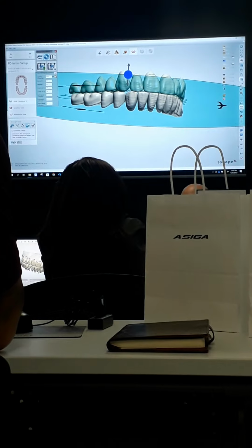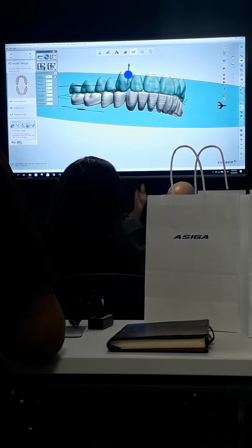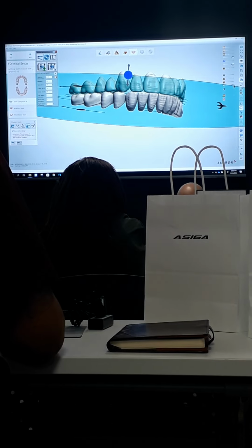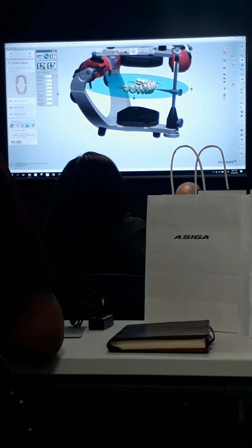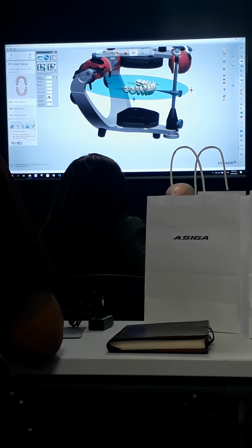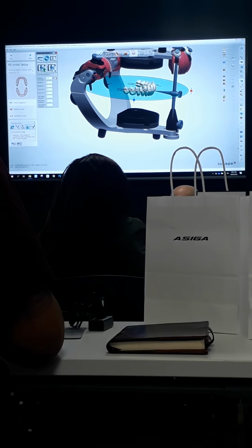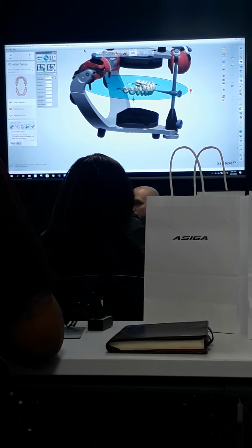This icon here is your setup icon. This is positioning it within the plane, making sure the teeth are in alignment in the virtual articulator. It sets the position of the arches inside, and then you can do your adjustments here. So if you adjusted, say, your Bennett right and left to 15 degrees, you transfer those in here. It tells you whether there's an issue with the distal or the mesial. Correct. So right click it. Which tooth? This one, right? Once the numbers are down, right click. No, you're doing left.